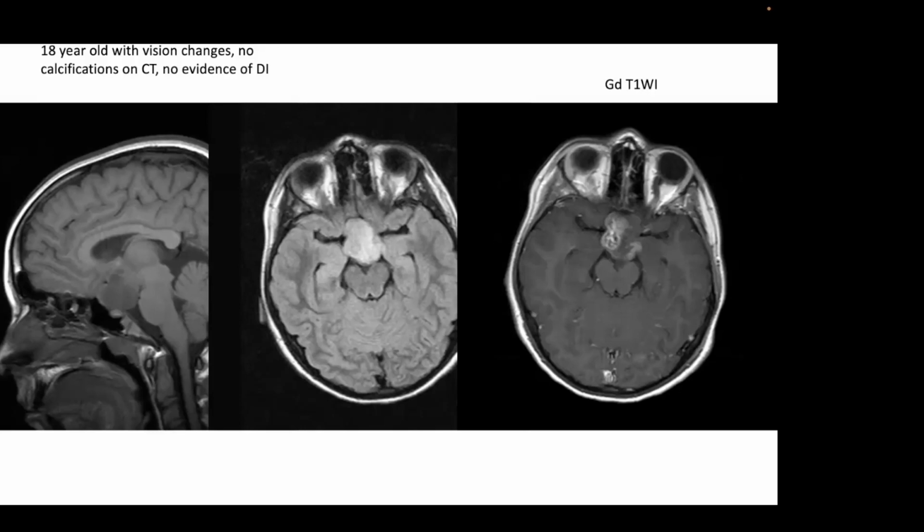Without calcifications. Hamartomas usually don't calcify, but what is it about this that makes that extremely unlikely? Hematoma should have a history of hematoma. I mean, post-traumatic hematoma or what? No, there is a disease called hypothalamic hamartoma. It's kind of an overgrowth of tissue, but the enhancement makes that really unlikely. So it is not a hamartoma.